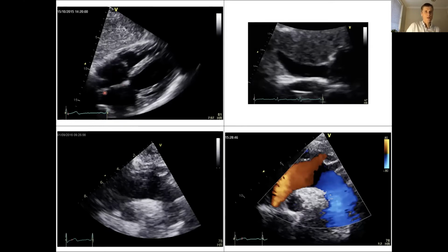Right atrium there, interatrial septum. This is a really key view to be looking at the interatrial septum, because as you'll remember, when you're imaging with 2D, the best images are acquired when you're imaging structures that are at a perpendicular incidence to the ultrasound beam. The top of the sector always indicates where the ultrasound beam is being transmitted from, so the probe's been held up here. Ultrasound beams are being directed down this way, and so the interatrial septum is almost at perpendicular incidence. So that's one of the reasons why it's really well seen there.